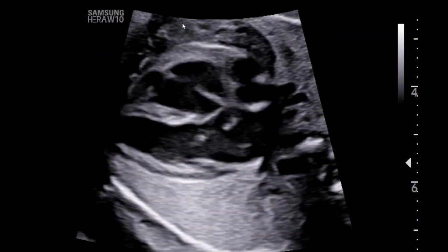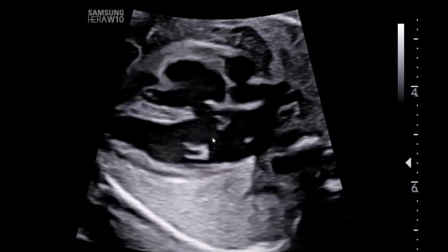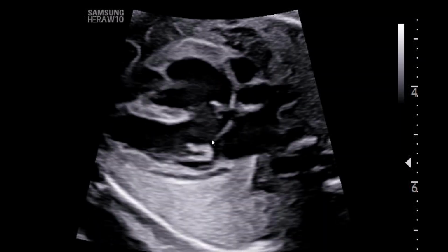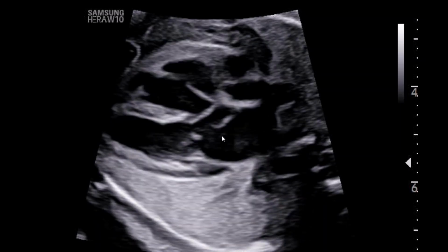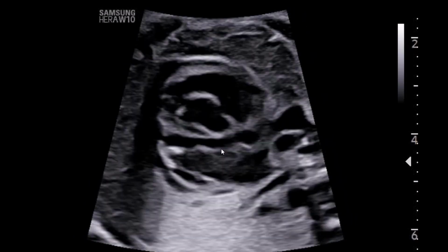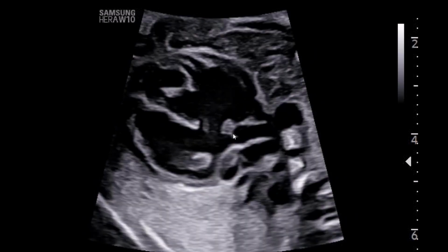Now we want to move back down to the four-chamber view and evaluate the outflow tracts. And here we're seeing that left-sided outflow tract, the LVOT here, is quite narrow and not quite picking up the aortic valve leaflets yet. As we move forward, you start to see the aortic valve here. Again, this is that subaortic posteriorly deviated conus tissue, and the aortic valve annulus, aortic root, and ascending aorta are all somewhat hypoplastic.